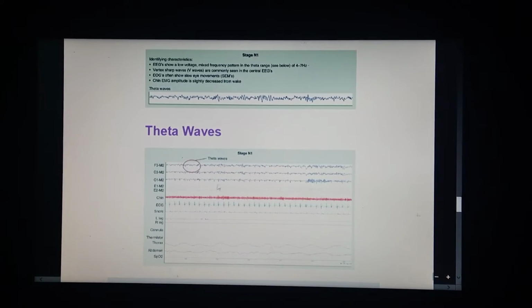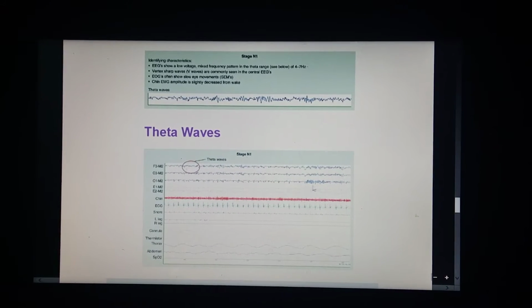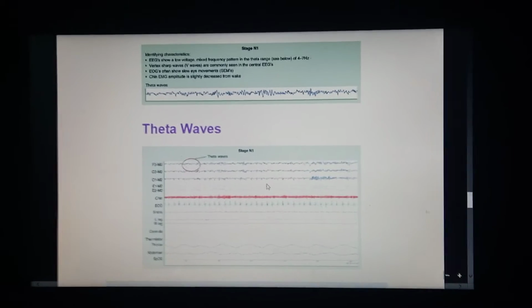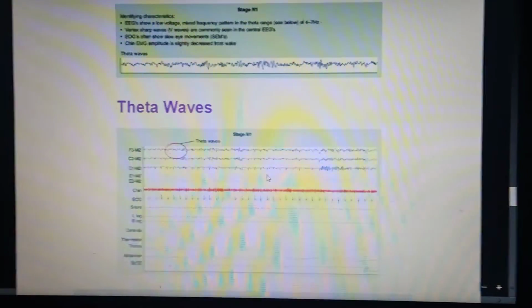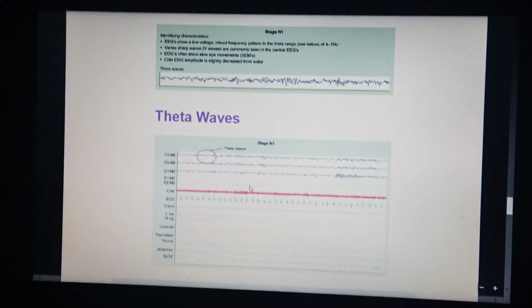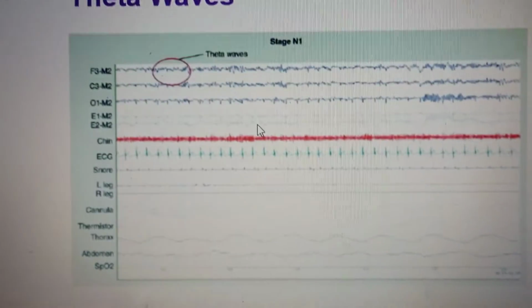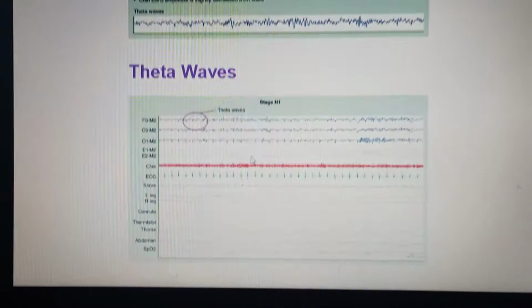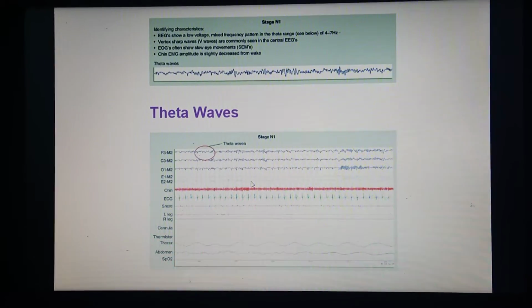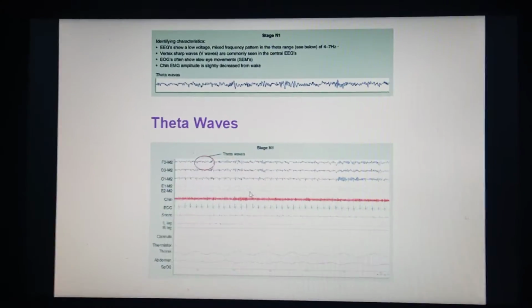And you will not see the alpha activity in the occipital lobe, but you can see a little here. But this alpha is not more than 50%. So in this epoch, you will see mostly theta pattern that is more than 50%. And you can see the eye blinks, and there are slow eye movements. So this whole epoch could be scored as N1 pattern. So this is N1.